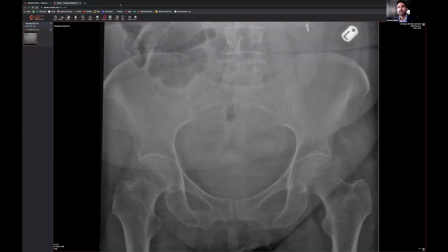So what I found a lot of the time is that people will do all the right things by drawing around the pelvic brim, making sure that's all nicely aligned, and drawing around the femoral heads. But what you really also should do is draw around the lateral femoral neck, the more medial femoral neck, and the greater trochanter as well. Once you've done all the drawing, the next thing to do is to take a really big zoom in.